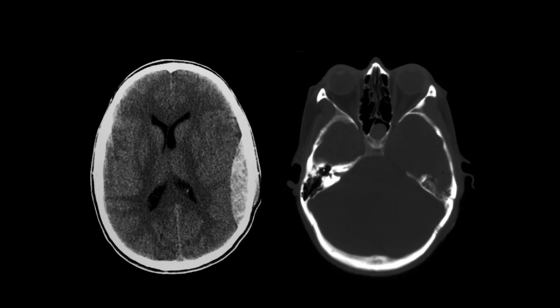This is a typical epidural hematoma. There's a lentiform, hyperdense collection in the left parietal region adjacent to the left parietal calvarium, and if you look on the bone windows, you can see a linear fracture extending through the petrous temporal bone. It's part of the fracture that tore the middle meningeal artery that caused this arterial hematoma.